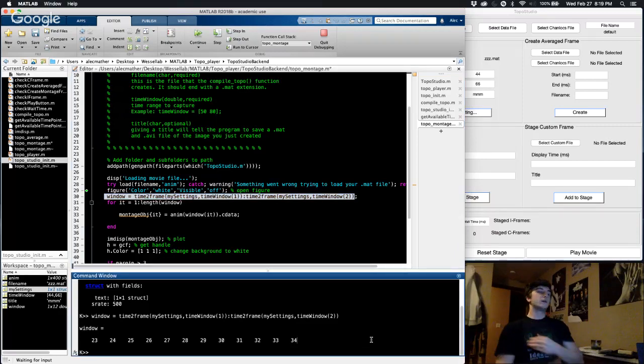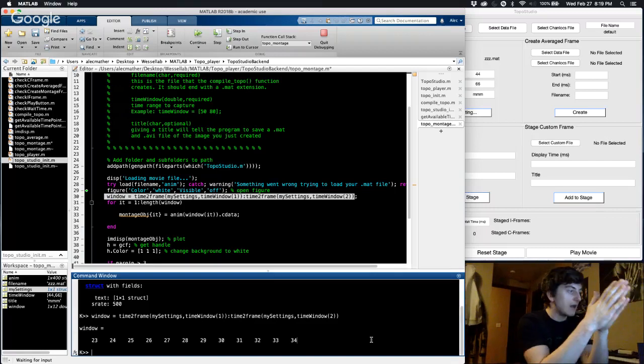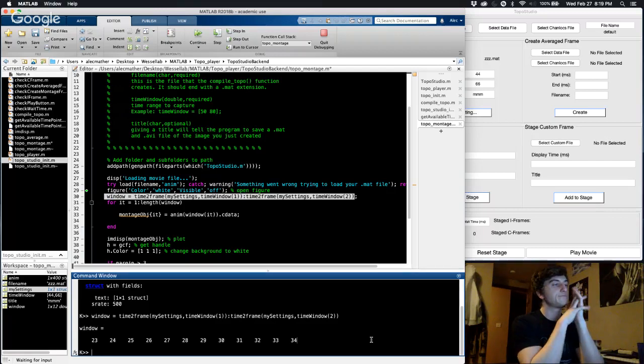So now we need to get our available points with that. Essentially the person is asking, give me everything that exists between this millisecond and this millisecond.